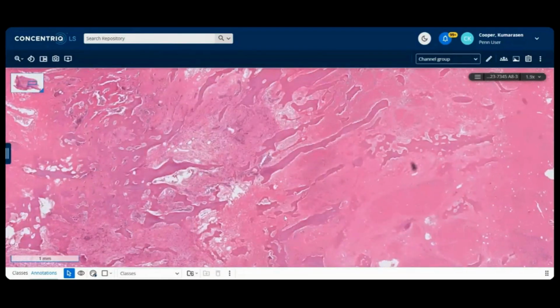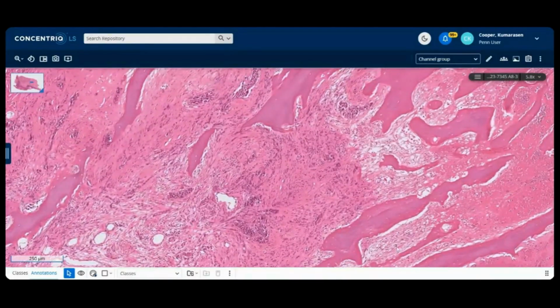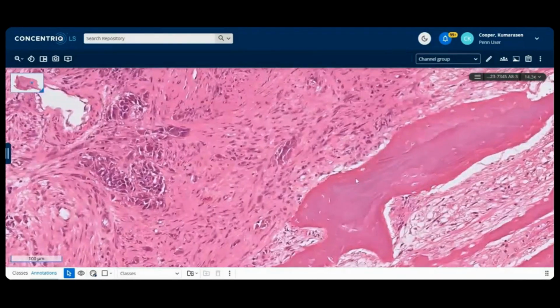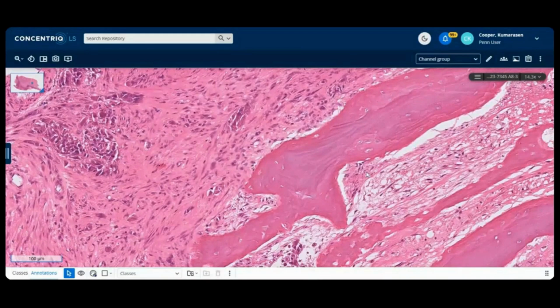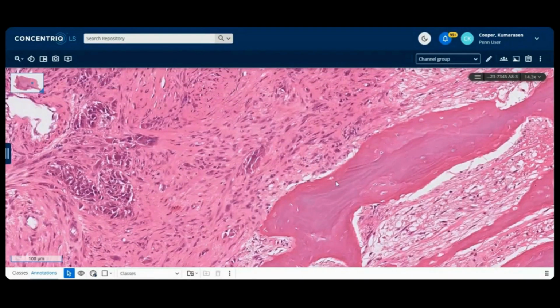and it's quite bloody as well. And you can see tumor cells invading here. So I'm going on high power just to show you these bony trabeculae. Some of them are non-viable. Be careful that decalcification can remove the nuclei. So before deciding whether the tumor is viable or non-viable, just make sure you look at the fat cells, because that's a useful, helpful clue, I find. If the fat cells are viable, then it's more likely that the decal has disturbed the nuclear morphology and you're seeing just halos without osteocytes.